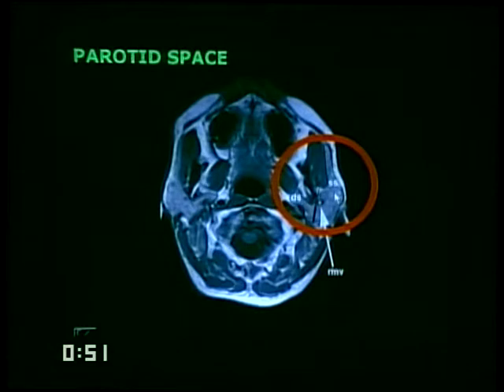Surgical anatomy, it's important to remember that structures in the parotid space are divided into the superficial segment and the deep segment. These are divided by a line connecting the retromandibular vein and the stylomastoid foramen, which is the anatomic plane in which it's a coronal sagittal plane. It's an oblique coronal plane in which the facial nerve lies. But you do not see the facial nerve, so it's a fairly random plane that exists behind the retromandibular vein.